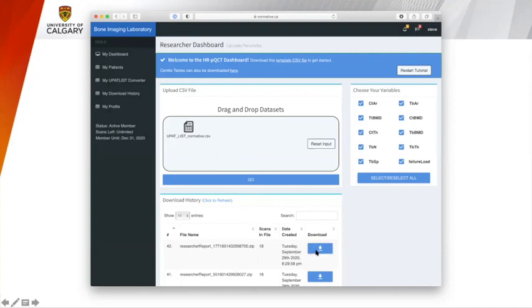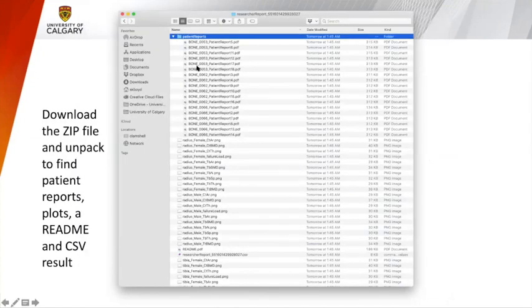And once you've got that download button showing, and in my case, it took about 3 or 4 minutes before it was finished calculating, I click on it and it downloads a file to my directory. So I click that and it downloads a zip file. That zip file I've opened up here, and I'm showing all the different files within the zip directory.